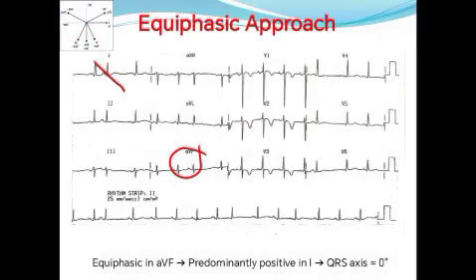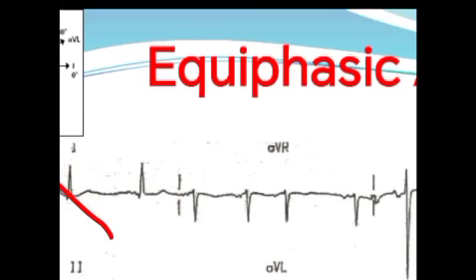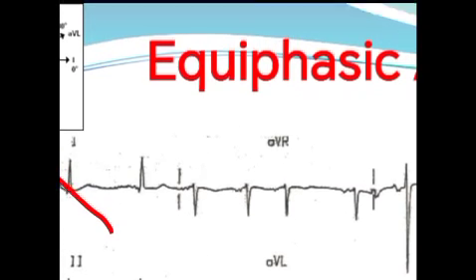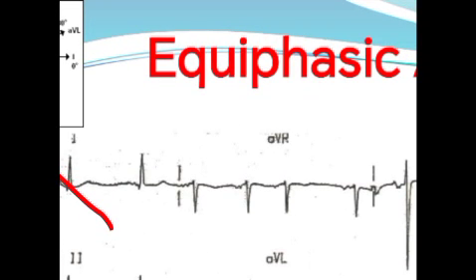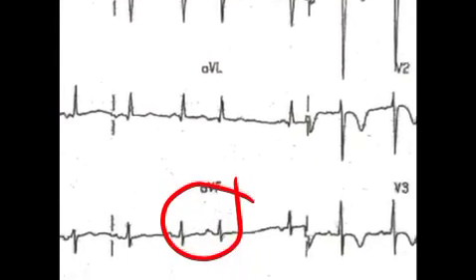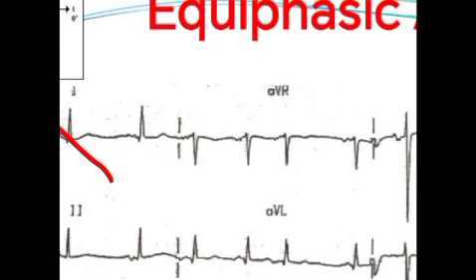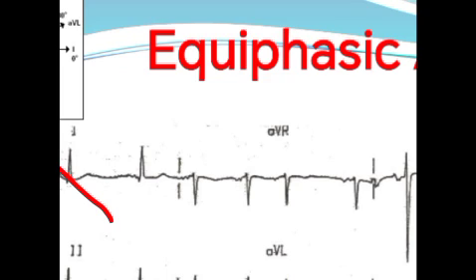Okay, I will show you here how it comes. We choose AVF, that is more observable here. This is the AVF here.